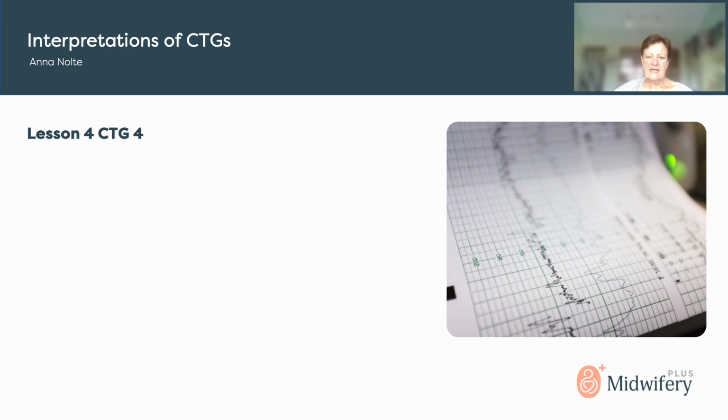You have already interpreted 3 CTGs before, so I'm sure you know exactly what to do and how to go about it. You have already completed your quiz. You have already seen what you have done wrong or right. And now I'm just going to interpret the CTG for you and go through it with you. Then we're also going to look at the FIGO guidelines and the NICE guidelines on how to classify this. And we will also talk a little bit about the management of the CTG.